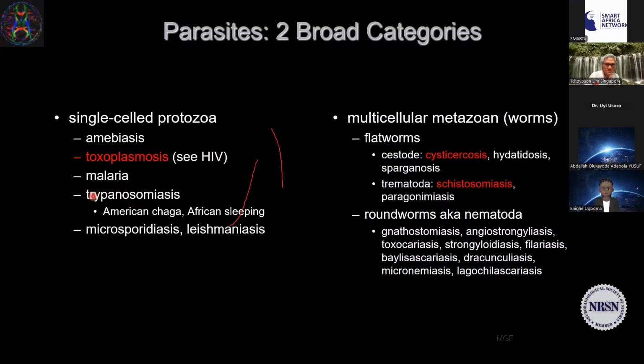Now, as an aside, trypanosomiasis is a very unusual diagnosis to make on MRI. The challenges in health systems means that the American trypanosome disease is sometimes diagnosed, but the African sleeping sickness is very rarely described in the literature. If anybody has a case, please contact me.